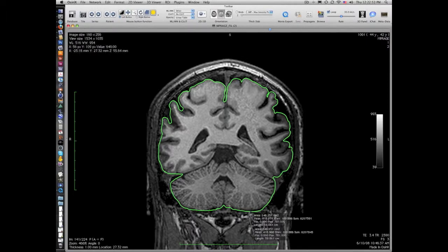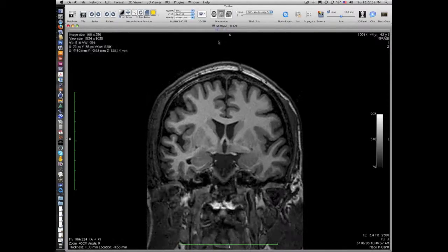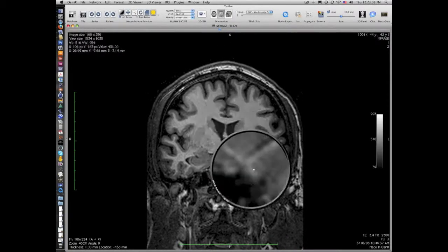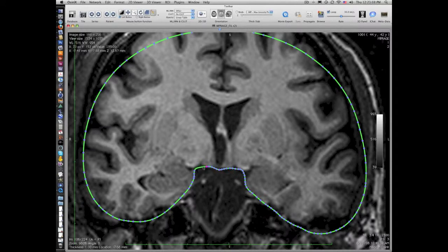And the other thing is that you only want to have one ROI. It might be tempting when you get down here to have an ROI for the brain, and then also one for these nerves, right? So you trace the brain like this, and then you're like, oh, and I also want to trace these. Well, the problem with that is that when you go to set black outside of the ROIs, it will make this entire slide black, and so you don't want that, right? So the way you would do this is you would bring this out and encompass this area, okay?